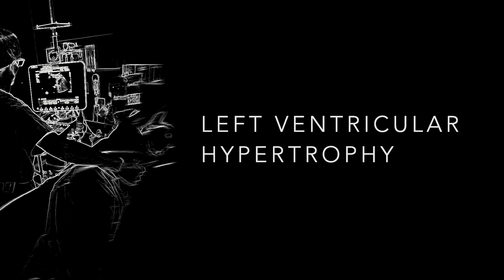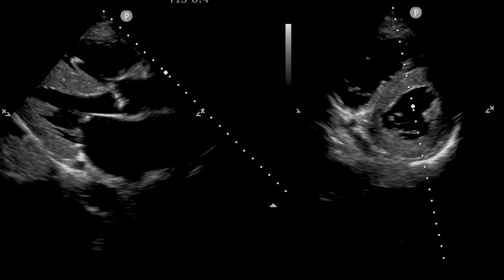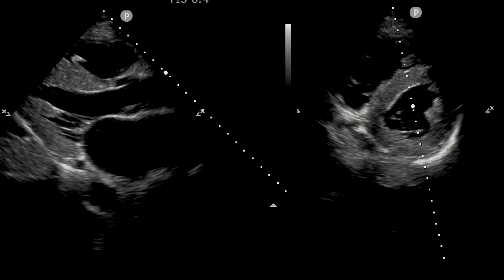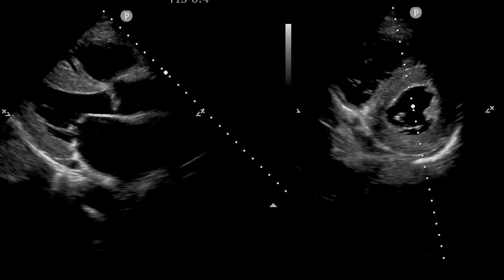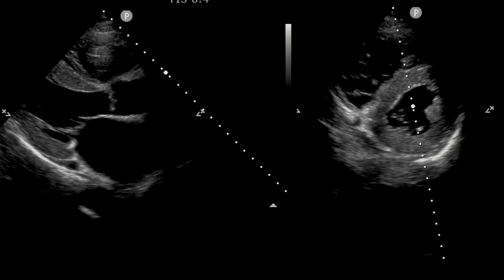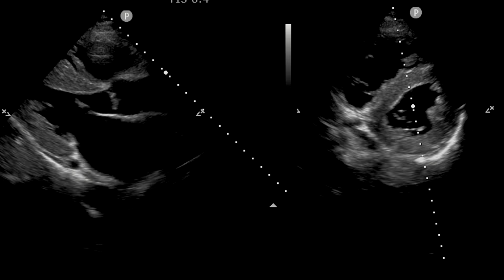The third one that's challenging on a similar note is this left ventricular hypertrophy. As hearts are put under greater and greater afterload stress, right, they're going to remodel, they're going to hypertrophy, and become thicker and thicker and thicker. And so this can have the appearance of moving quite well, but again, you have to look at what the wall is doing, what's that relative chamber size. You can have decently thickened and hypertrophied hearts and low ejection fractions.